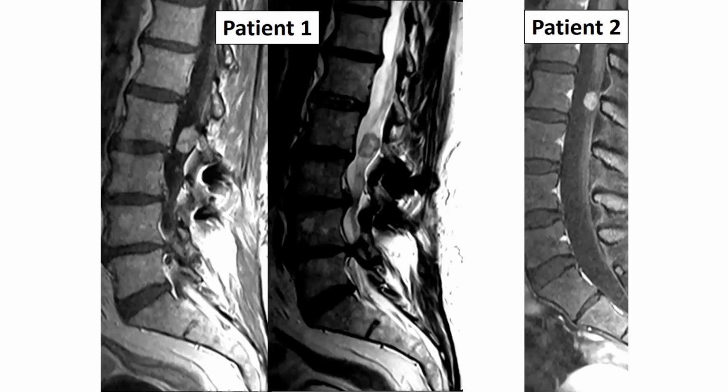All right, here we go. Patient 1, patient 2. You can see these are both sagittal, pretty much mid-sagittal MR images. I'm showing you 2 for patient 1, which is T1 post and a native T2. You can see the fat, right? And then on patient 2, it's just a T1 post. Okay, can everyone see the lesion? I think you probably can. These are in the lumbar cistern, 2 different lesions. Now the question is, what is your differential?